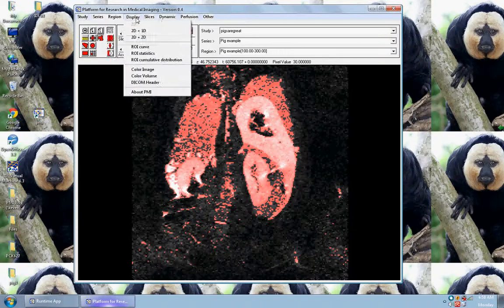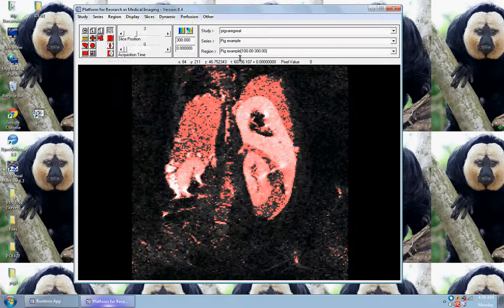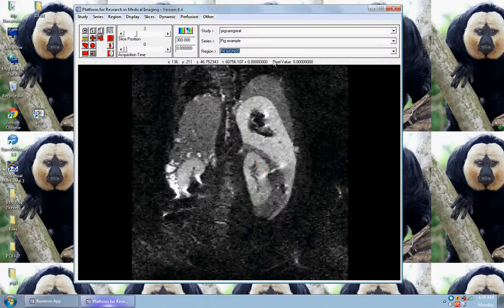And perhaps another very useful tool is if we go back to our previous example there, maybe this image, let's go back to the oldest one, maybe we only want the pixels with the larger signal from this region, and most of them we don't want.